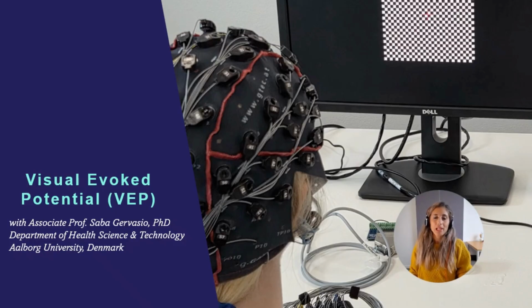So visual evoked potential is an EEG-based technique which is quick and non-invasive and is very useful to diagnose conditions or disorders affecting the visual system.